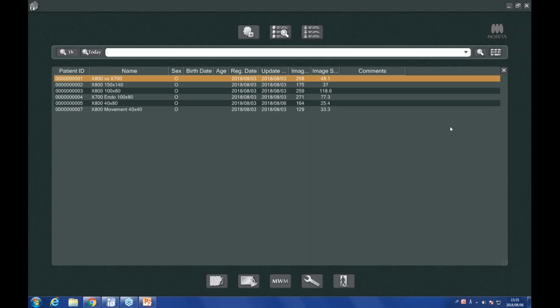As you can imagine, we've anonymized everyone, so the names of our patients are very much machine-centric. So definitely not what you're going to see in an actual practice, but nonetheless, for illustration purposes, this will be enough.